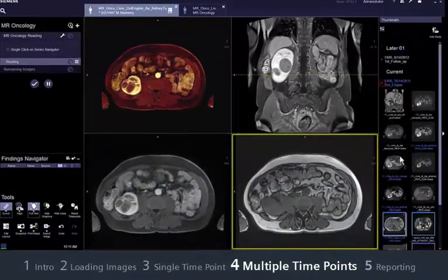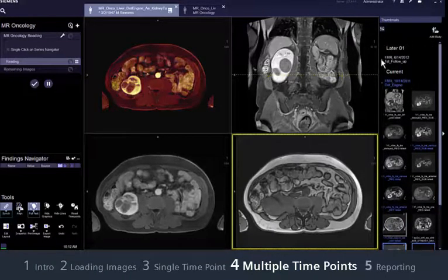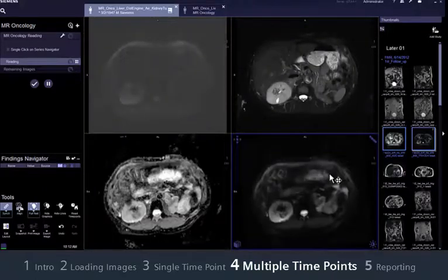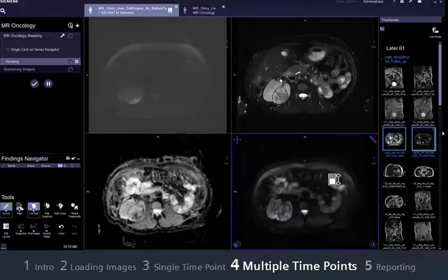To display series from both studies, select the interesting series from the current and the prior study by holding the Control button pressed, using a right-click drag and drop to the image area, and then selecting the Image Display option Replace All. All series will be loaded in the display area and can now be compared. An automatic registration is performed to help you in the comparison. Use 3D reference point shortcut R.